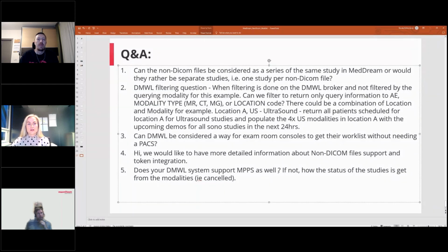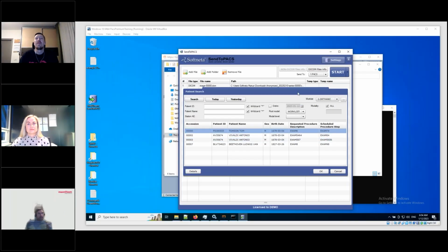Who is going to answer? Marius, can you share the SendToPACS interface? So at the moment you can filter by AE title, by modality type, and station AE title.